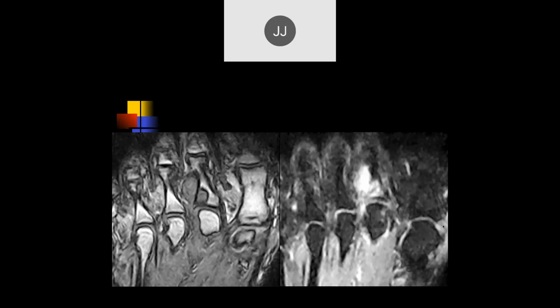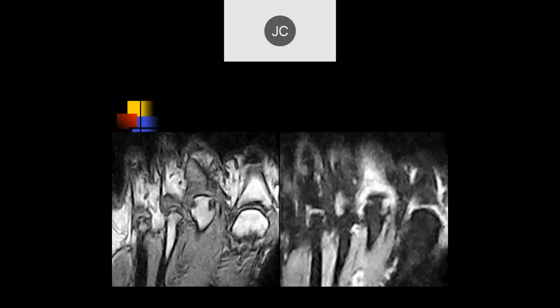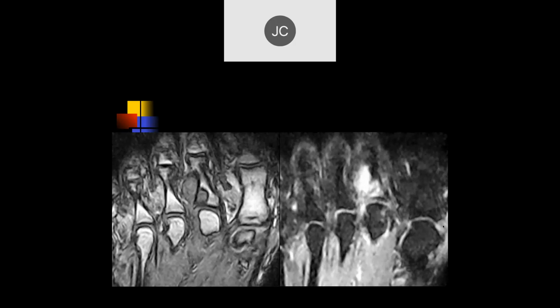Okay. All right, so it looks like at the proximal phalangeal base of the second digit, we have an erosion. That's some inflammatory tissue there, adjacent to it. We're kind of dealing with periphery. So it certainly looks like you've got pannus formation here and erosions. So we need to be concerned about an erosive disease.